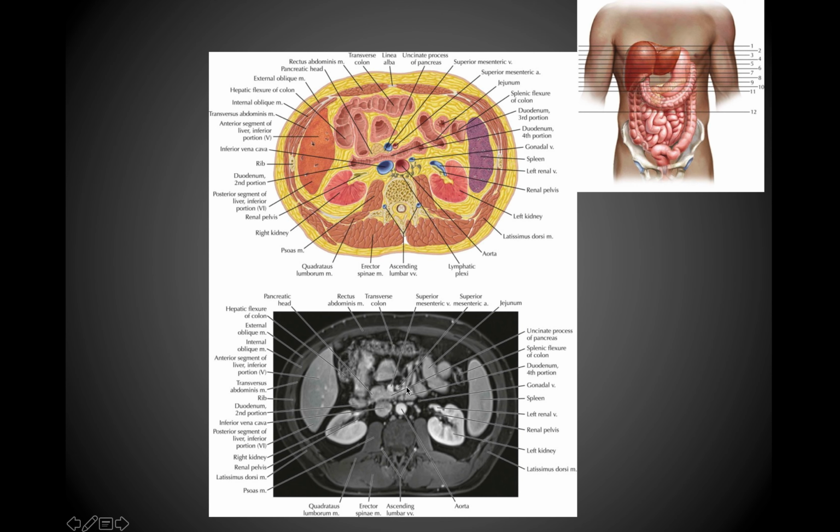So we're seeing more small intestines now. Again, you're going to see multiple loops of small intestine. You also see part of the transverse colon coming across. So again, you can see transverse colon all right here, including the hepatic flexure. Whereas over here you see just part of the jejunum, and you can also see the superior mesenteric artery as it's going over the part of the duodenum. So keep that in mind.